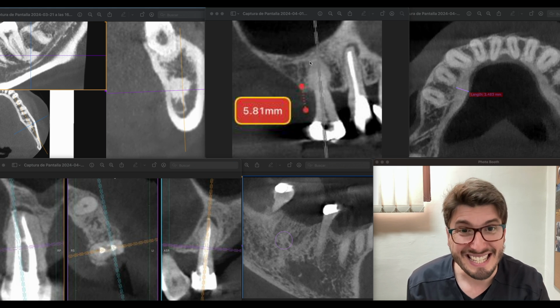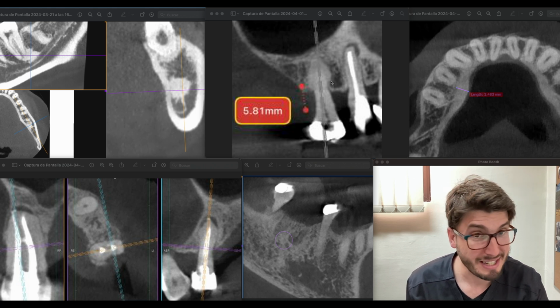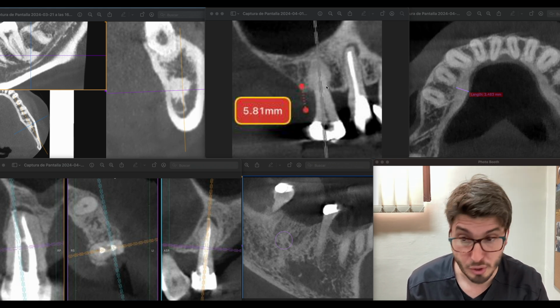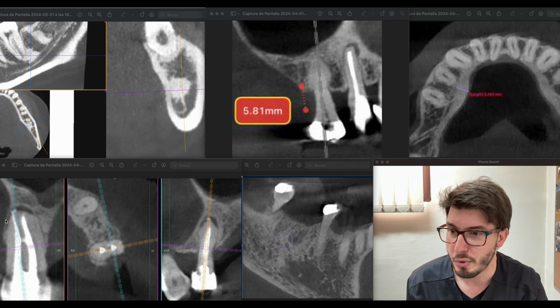But then we have this radiopaque lesion, okay? And then what's happening here is that the root is a little bit thicker, right? The root is a little bit thicker. Usually this tooth is vital. We could see the lamina dura and the periodontal ligament space in most of the cases. So this would be hypercementosis, okay? Just like this case over here, right? So I hope you guys were able to confirm that as well.